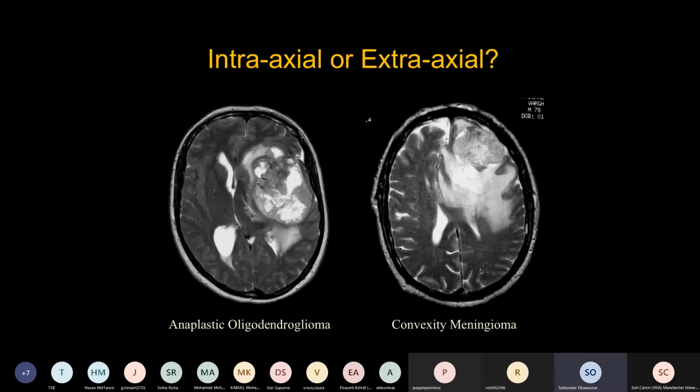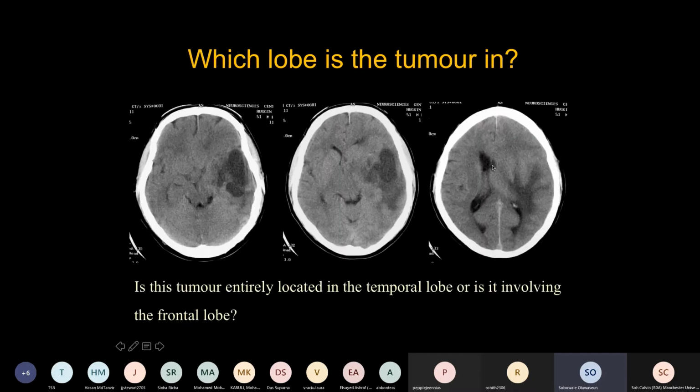And that on the right is a meningioma. The way we tell is that in this lesion, we find what we call CSF clefts. And the lesion arises from outside the brain and pushes the brain inward. It pushes in the gray matter, it pushes in the CSF, and it pushes in vessels that are interposed in the subarachnoid space. Okay. So that's one thing, it's inside versus outside.